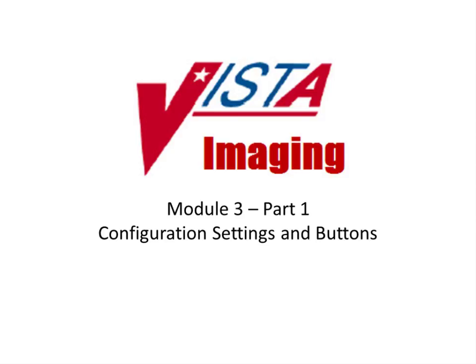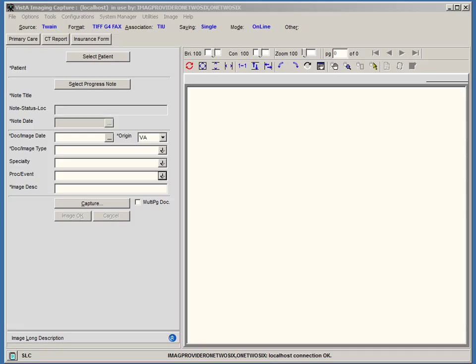This is part 1 of Module 3 in the series of Vista Imaging Clinical Capture training modules, and it will cover the configuration settings bar options and configuration buttons. It is suggested that the modules initially be viewed in order to become familiar with the options necessary to perform document scanning and image captures.